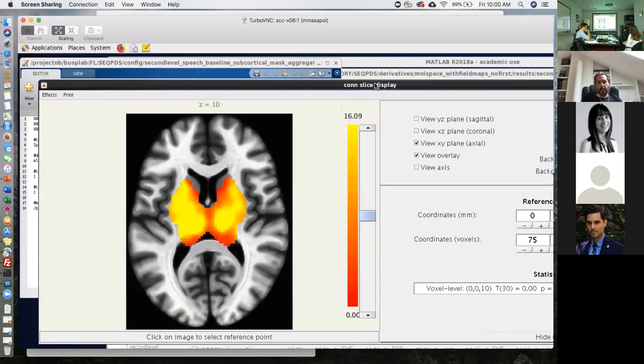And this implicit masking basically tries to not run analysis in uninteresting voxels. So within subjects, that is voxels that are outside of the brain for that subject, and across subjects for second level analysis, that happened in voxels where originally any voxel that had been considered as outside of the brain for any one particular subject would be removed, and now it doesn't happen. It basically only masks out those voxels that have been considered outside of the brain for every individual subject, as part of the implicit masking. So there are two masks, the explicit and implicit. The explicit is the one that you specify in that file, and the implicit just happens always. It's just a way to remove uninteresting voxels from the analysis themselves.